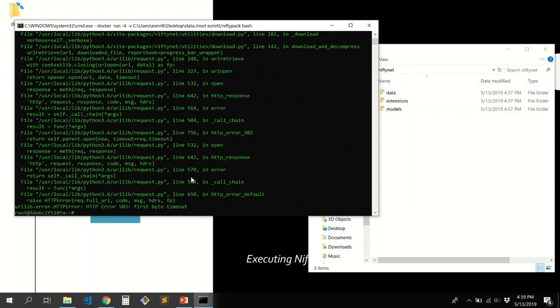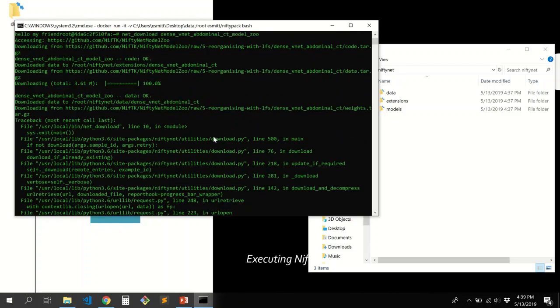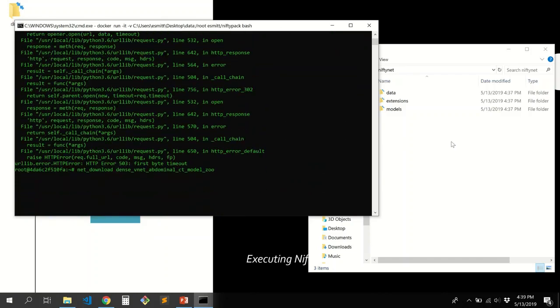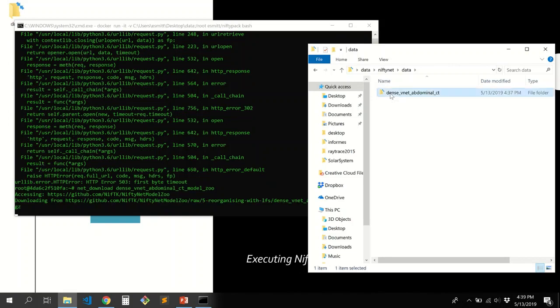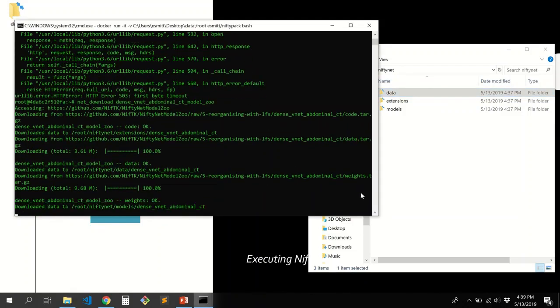Okay, I have a timeout. This is not a performance timeout, it's about the connection. The request is not complete. Maybe my connection, or several people, or the server there. I have no idea. Well, let me check and see if I downloaded something here. But yes, I will check that. Let me wait. Okay, now it's downloading the weights, so this is great.